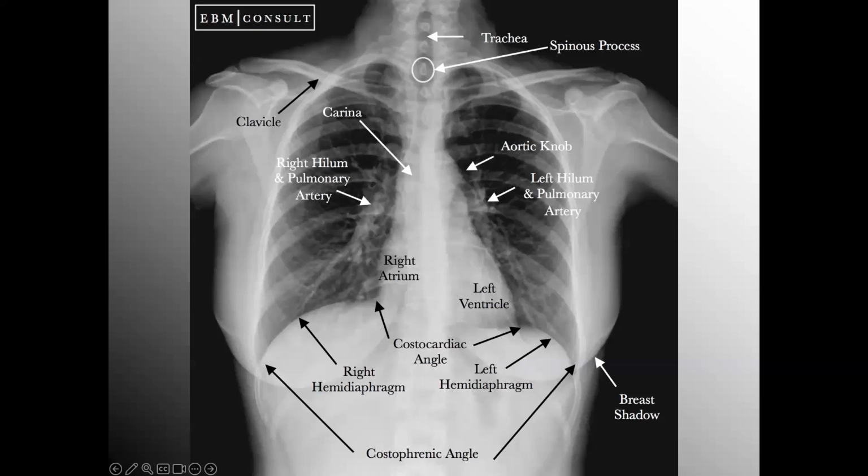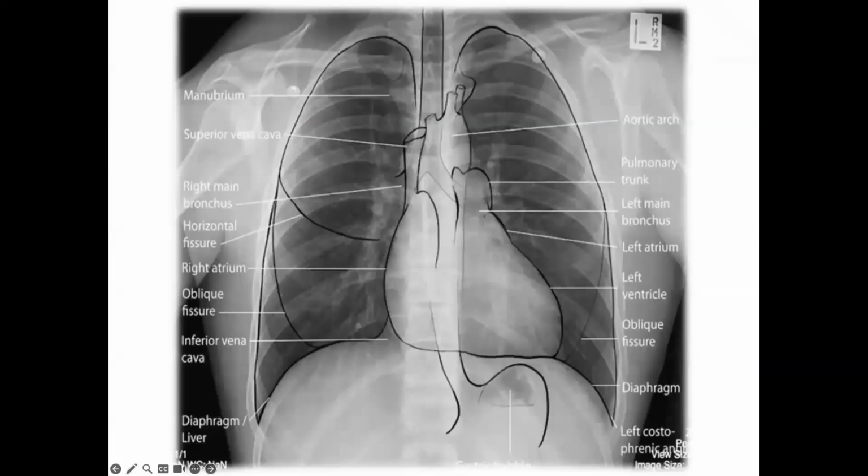Any type of bony apparatus, any type of soft tissue, such as the heart, yes, there's some variations, but most of the time we know that the clavicles, the heads thereof of the clavicles, should not typically move in a dramatic fashion. We know that the spinous processes of the vertebral bodies should not be out of alignment. Now, there are, of course, pathology to everything, but just forming a perspective to start.